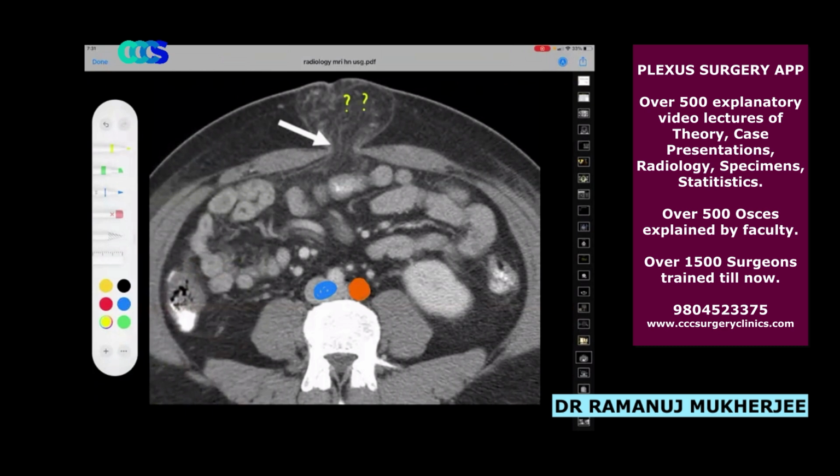In this one, I'm not very sure about the vascularity, but a white dot in this area suggests that this probably is a viable piece of omentum, but it is an irreducible one because the neck of the hernia is like this.